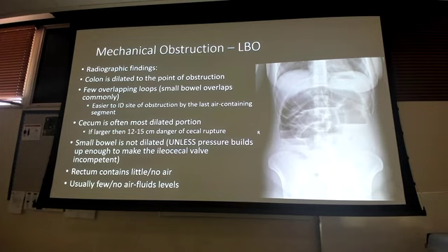On this side here, possible, right? This is my transition point. What I'm saying is I see small bowel, is it air fluid levels? Maybe, I don't know. I'm using my valvulae conniventes as my small bowel. So you can look for it. A lot of times it's not going to be there, right? And that's why I say I use this first. I pointed this out because what this one is, is the overlapping of the different types of bowel that are sitting right there. And it looks like an air fluid line. Maybe this, I don't know. It's hard to tell. So focus on your large intestine transition point and the haustra.